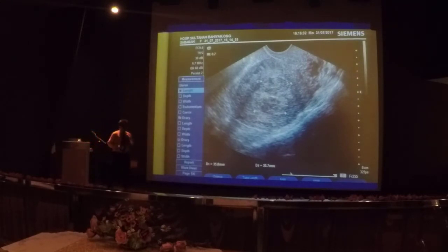Probably Datuk can buy a new scan for me. So this is another example of this. So this one, who can describe? Cari kan? Atas tau.